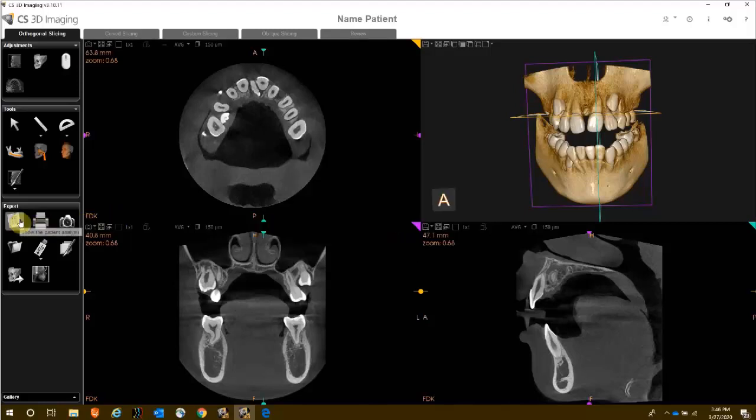Simply go back and click on Show Patient Analyses, and you will see if you'd like to open the initial or the secondary analyses. The patient analyses allows you to save the views and the settings for patients, including any drawings, measurements, or implants.